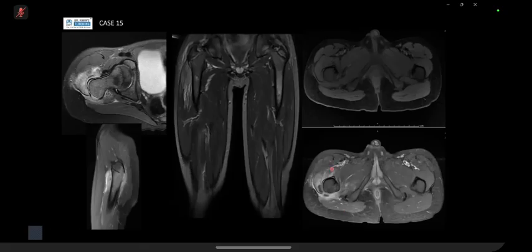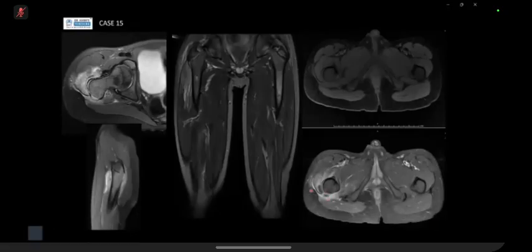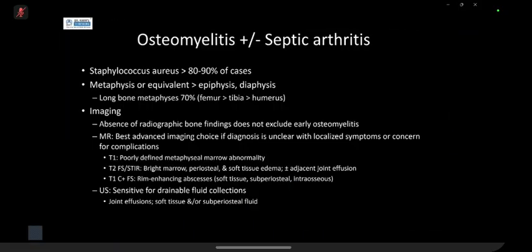So looking at these pictures, there shouldn't be a differential of Ewing sarcoma, because the post-contrast findings are the giveaway. That looks like an abscess with surrounding enhancement. And a reason why is because this is a cortical breakthrough from the periosteal abscess. Now, osteomyelitis can happen, so we'll just go to the next slide first.